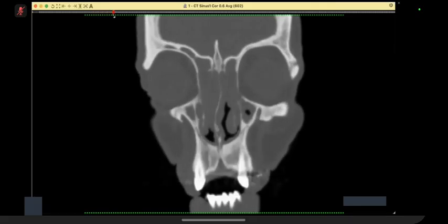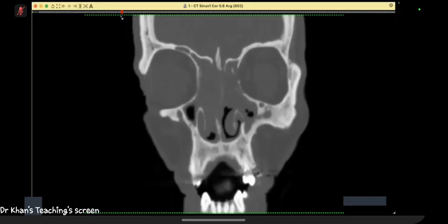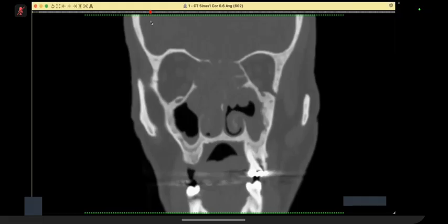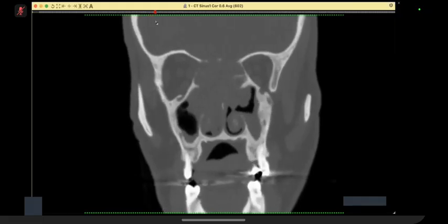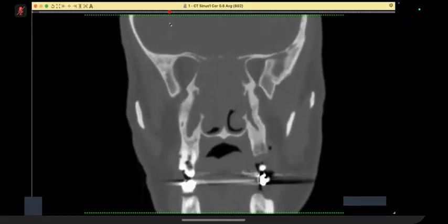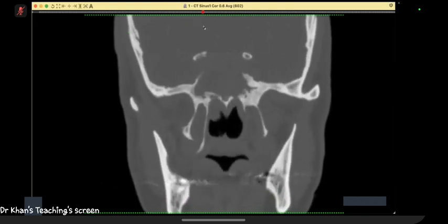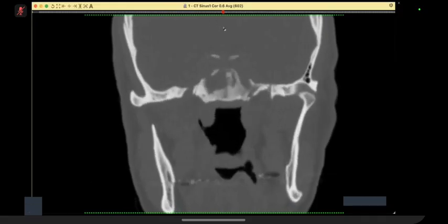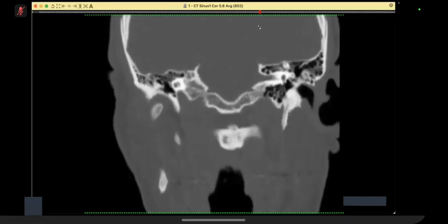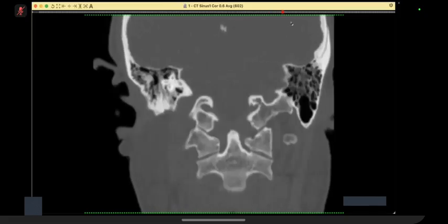Over here, I can see that there is rarefaction involving the bones, the nasal septum, also the inferior turbinate, with non-visualization of ethmoidal trabeculae and widening of bilateral OMU, with erosions also involving the base of the skull, I think even the right clinoid process. It is also involving part of the sphenoid sinus and anterior part of the clivus bone.